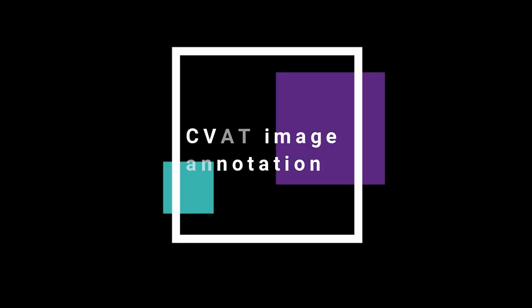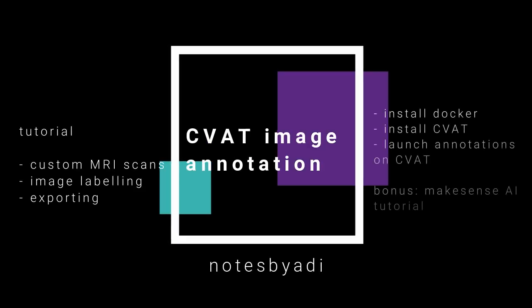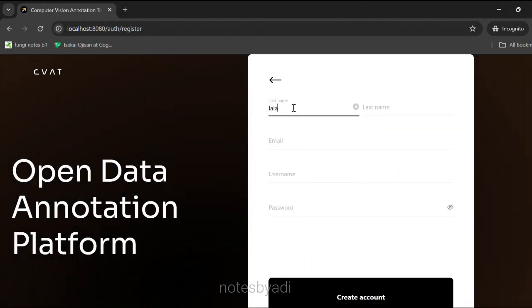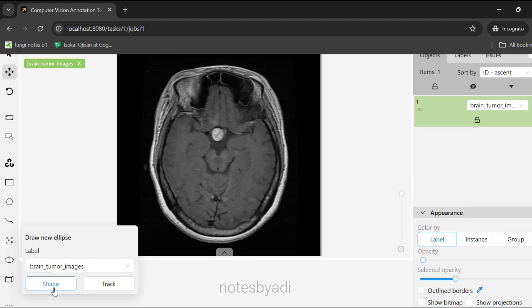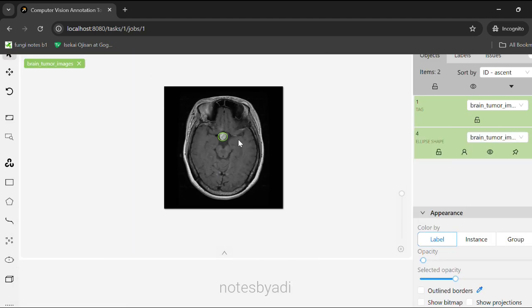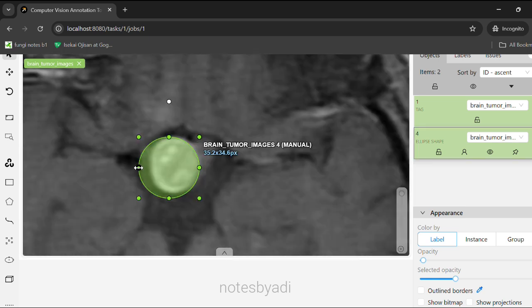For most image analysis projects, especially to do with machine learning, there is a great need for accurate image labeling or annotations so that the downstream input for modeling is as correct as possible. To achieve this, CVAT offers a very clean-cut platform to read in as well as read out image labeling data.